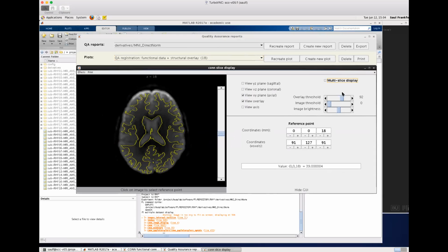We showed an example from, I think, the S-rate or ACE study, where if you just quickly look, it looks like it's all right, but then you notice that, wait a minute, the bumps in the yellow contour are not aligning with the changes in the brightness in the functional image. So maybe they're not fitting all that well.